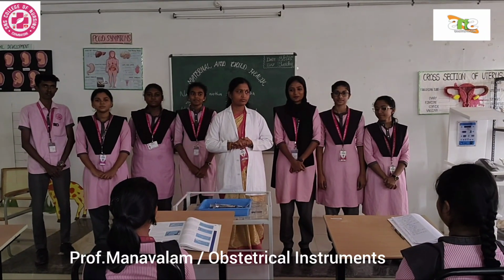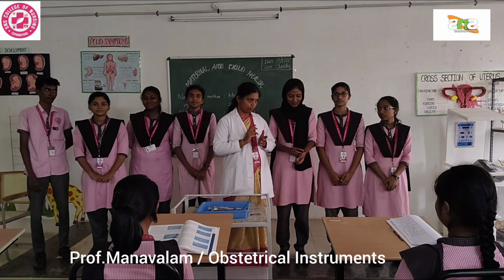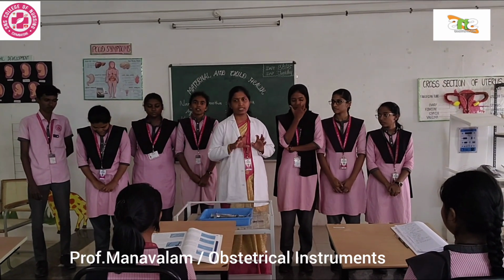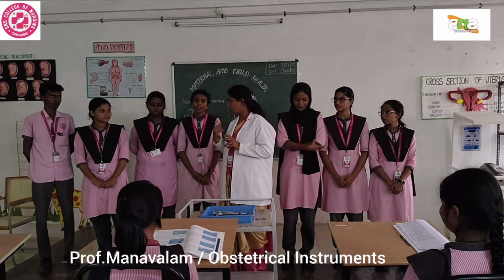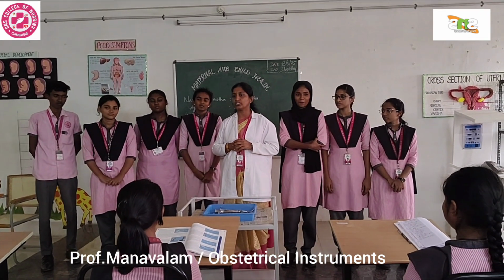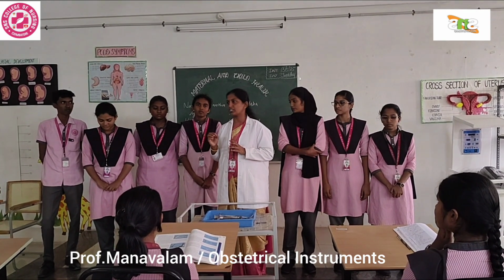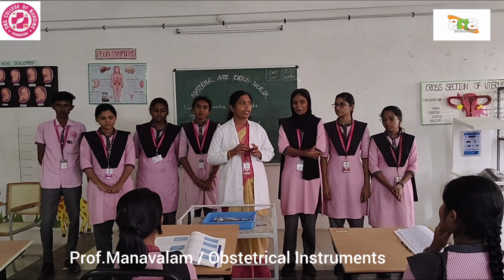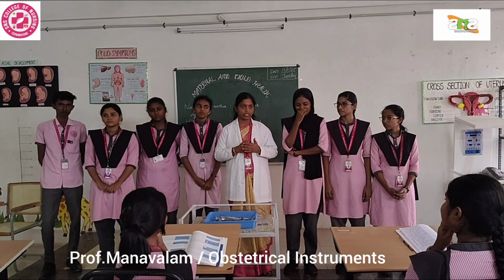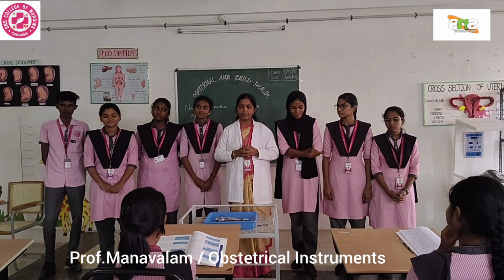Good morning to everyone. Today we are going to see about the obstetrical forceps and the instruments. I am going to give the general introduction about this, followed by me, the final year students will explain about each forceps in detail, as well as the instruments commonly used in obstetrics. There are different varieties of instruments used in obstetrics to make the delivery process easier.